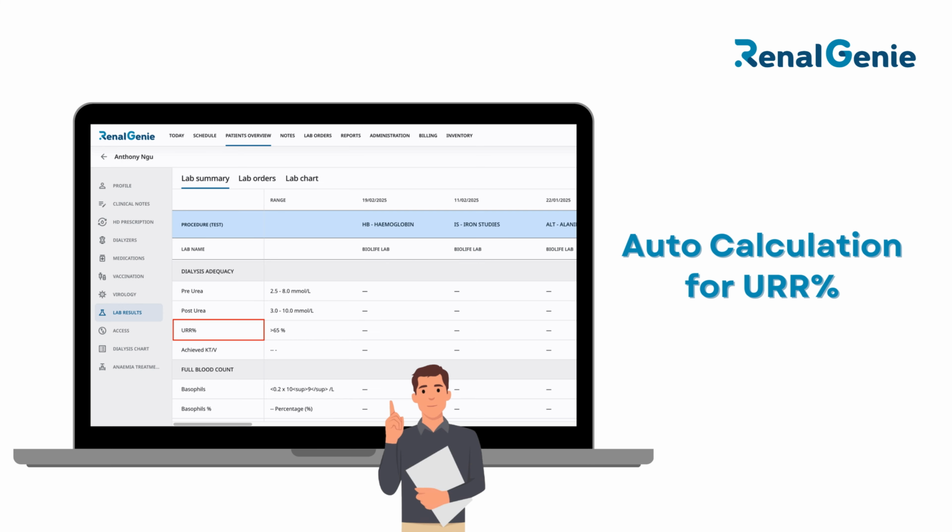This video demonstrates adding and modifying predefined URR, with auto-calculated URR displayed in the lab summary.